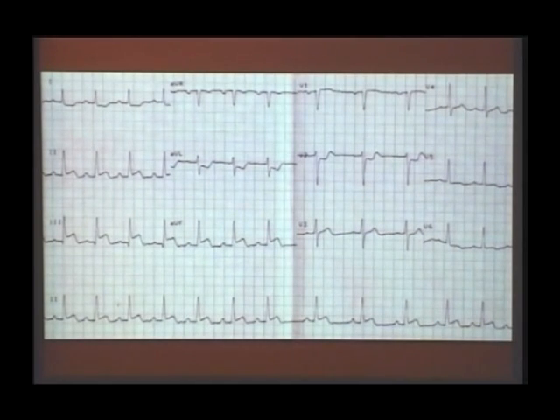The posterior ST depression, here you see, is a reciprocal depression of posterior ST elevation, isn't it? The ST depression you see in V1, V2 is once again reciprocal depression. The posterior wall is showing the ST elevation. That means the ST is going towards posterior leads and going away from your anterior leads. That's why V1, V2 show ST segment depression. In a classical inferior wall infarction, you will have reciprocal depression in the opposite group of leads, that is L1 and AVL will have ST segment depression.